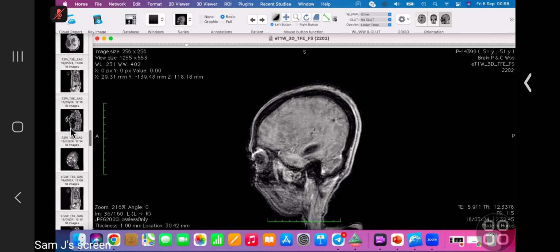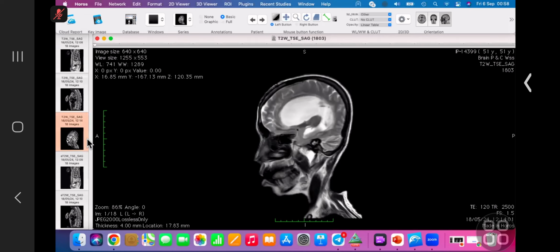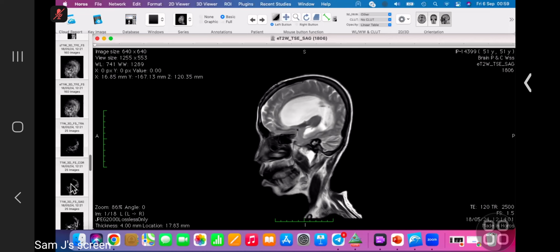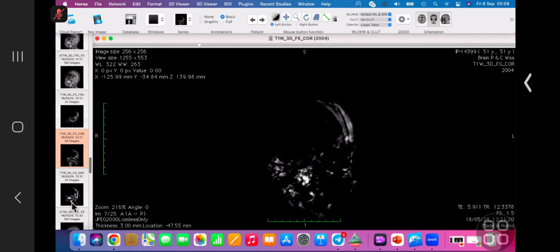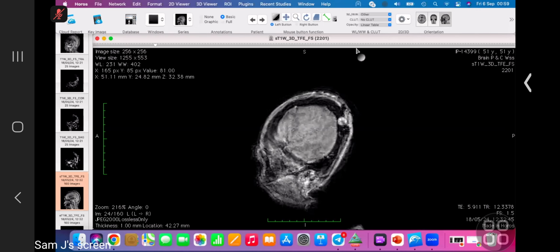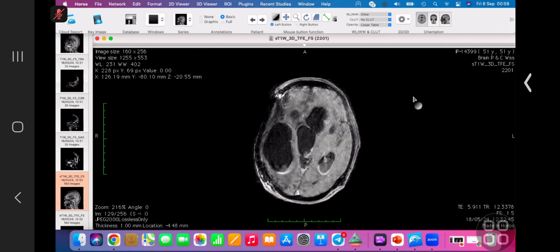Just a minute, let me show you the correct sequence. Yes, you can scroll.